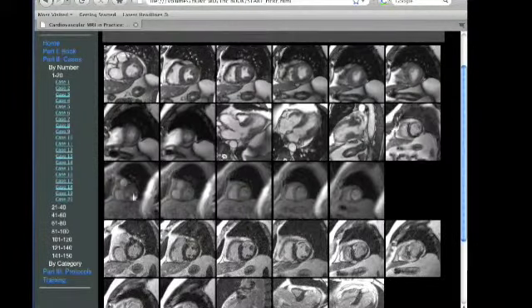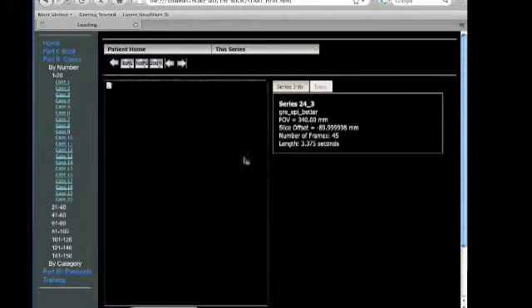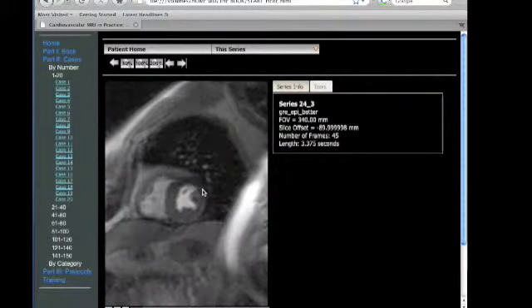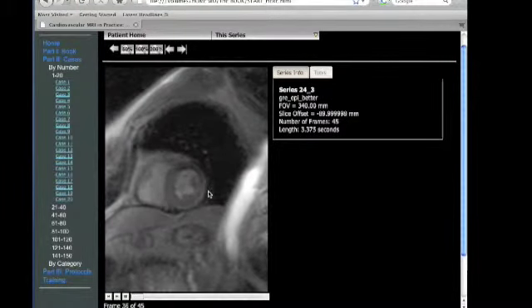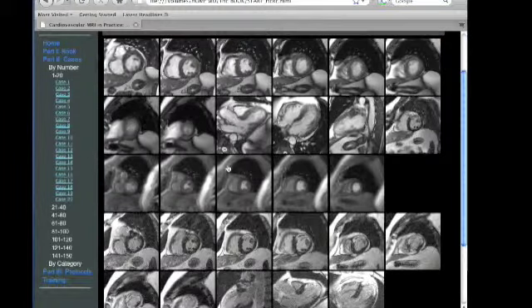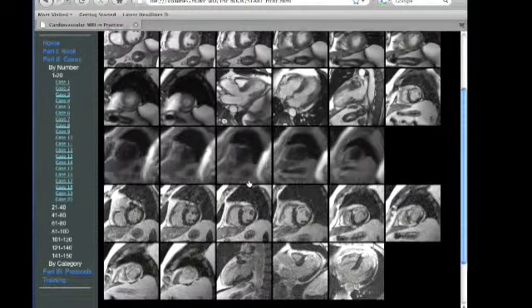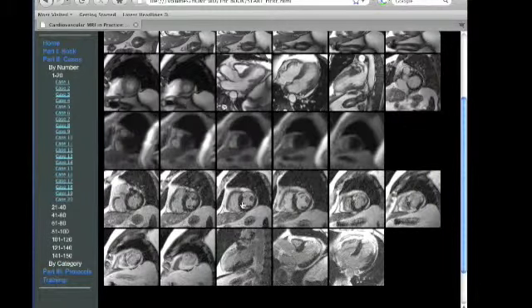Perfusion images are seen in the 3rd row and are obtained at rest and confirm abnormal perfusion of the anterior wall, which can be due to either inducible ischemia in the instance of a stress perfusion study, but when seen at rest indicates resting microcirculatory disturbance or resting ischemia.